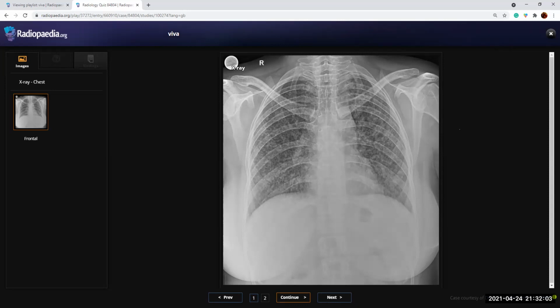What if I tell you the patient has cough? What if I tell you the patient has fever, cough, and weight loss? Then if it is fever, cough, and acutely unwell, it can be miliary shadows of hematogenous spread of tuberculosis, also a possibility if it is acutely unwell, like miliary tuberculosis.